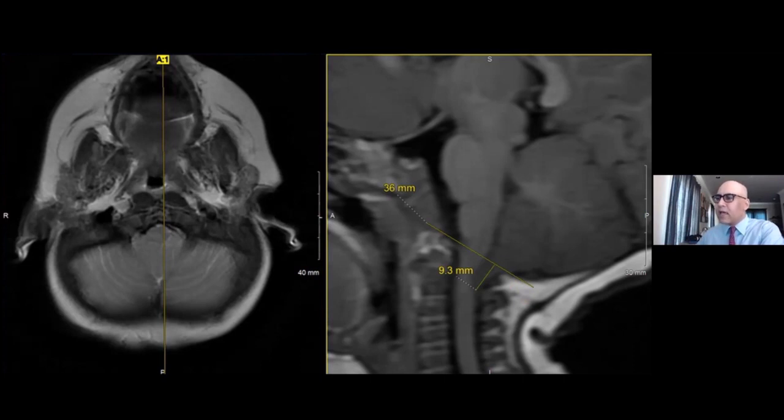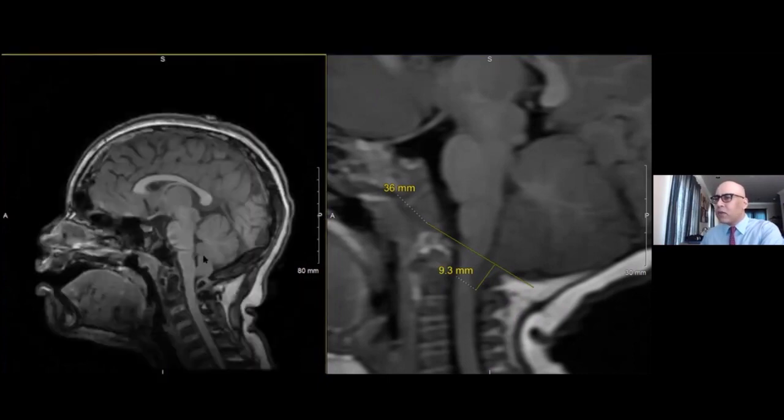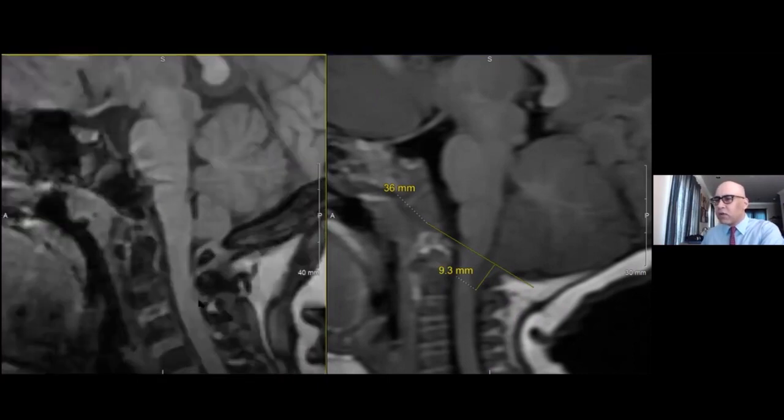This patient had tuberous sclerosis complex. They had no symptoms that we were aware of related to a Chiari 1 malformation. So they were followed closely because we knew that they were going to get detailed neurologic follow-up and detailed imaging follow-up. Well, a few years later, if we look, there's actually no longer any cerebellar tonsillar ectopia.